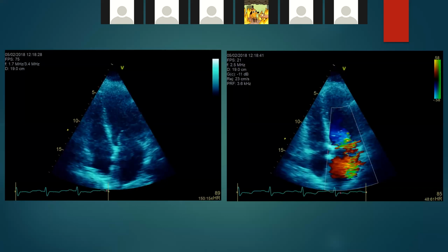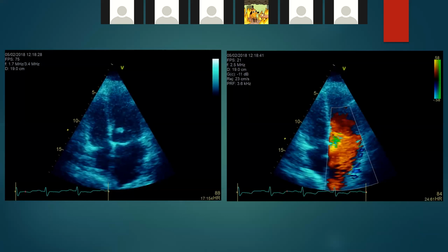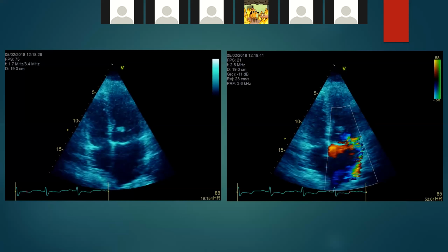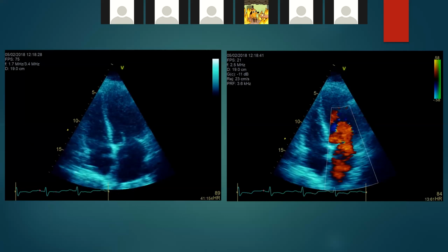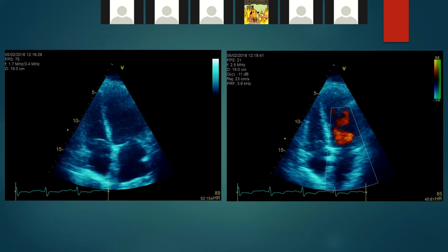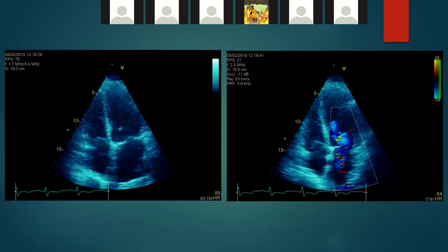So there are a lot of concerns about using color, but when you have these large eccentric jets that are very wall hugging and almost curl all the way around the atria, that signifies a large amount of kinetic energy behind them. I guess that favors more severe regurgitation, even in the absence of color jets that take up the prescribed amount of left atrial volume.